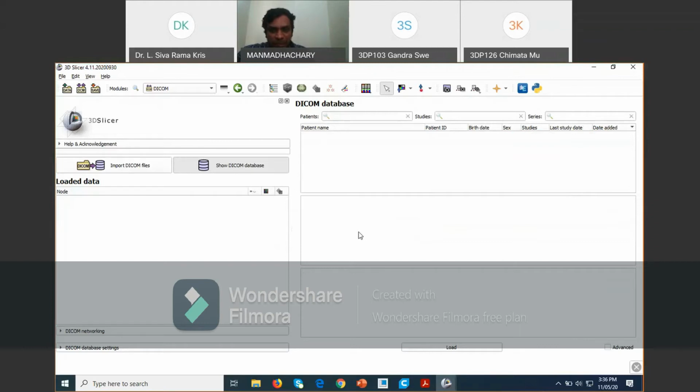Okay, like this will appear on your screen, Sai Kumar, like this one. Then choose the Sai Kumar and then click the load. Now the DICOM is loading. I think all of you got this window. Taya Palu, I think, and Dhanraj, are you able to do now?